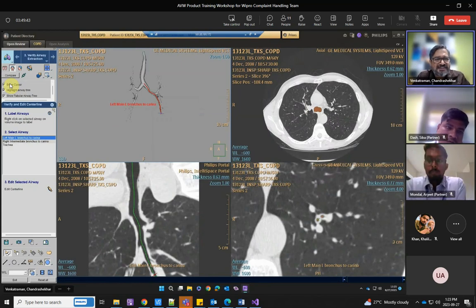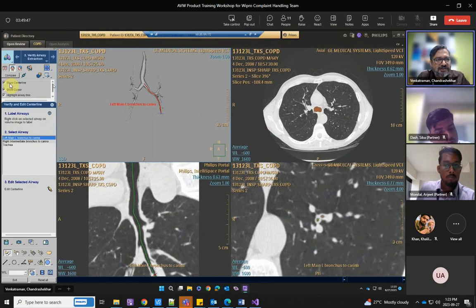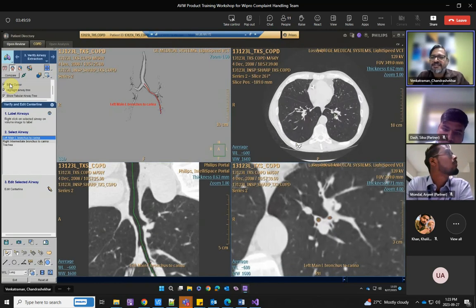This extraction stage is just this much. Other things, of course, this is the regular tools and what we want to visualize. Show or hide this center line, cursor, whatnot. Now here we also have, this is of course the volume, straightened MPR, and we also have cross section over here. This is a cross sectional, and that's the regular axial MPR.